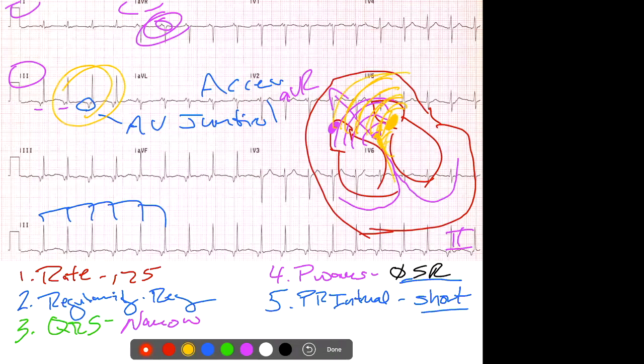Clinically, how important is the distance of the PR interval to treat an atrial ectopic rhythm versus a junctional ectopic rhythm? I couldn't care less. If you want the honest truth, clinically speaking, it makes no difference to me whatsoever. What matters is whether the patient is symptomatic or not. If these patients are athletes, it's not uncommon for them to have an atrial ectopic or junctional ectopic rhythm, or escape rhythm, and they're probably going to be fine, and I don't need to do anything other than just make note of it.